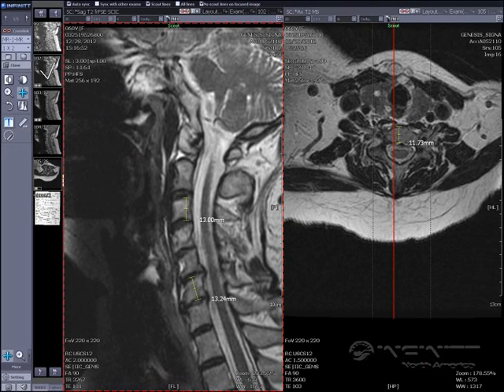If I have the patient with me, I might want to point out things to the patient. I can click on the text button, draw an arrow, and type in what the text would be. And click the OK button. And now here's my arrow with my text.